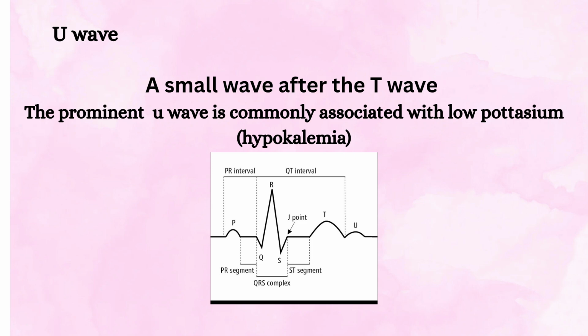U wave, a small wave after the T wave. A prominent U wave is commonly associated with low potassium, which is called hypokalemia.